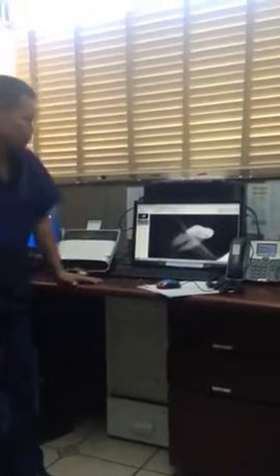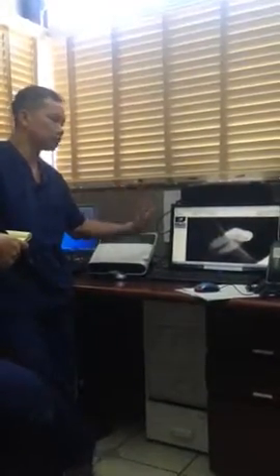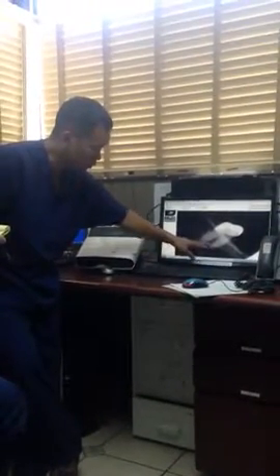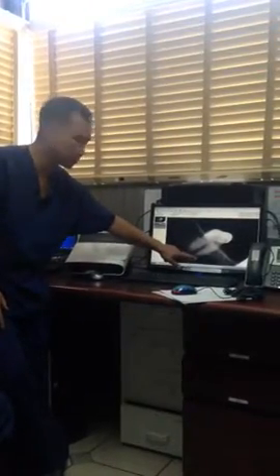This is an x-ray of the patient's chief complaint area. On this x-ray, I'm looking at the ligament space, and I don't see any problems down there whatsoever. No problems. I don't see an abscess develop down here.